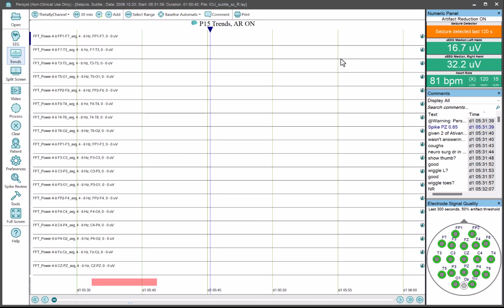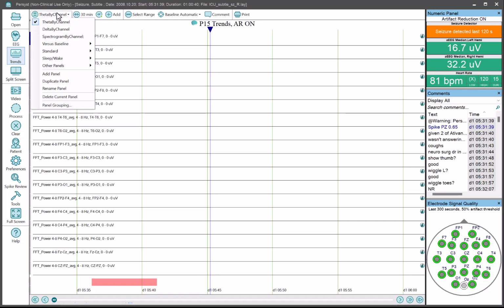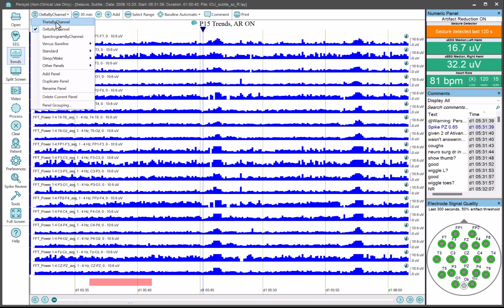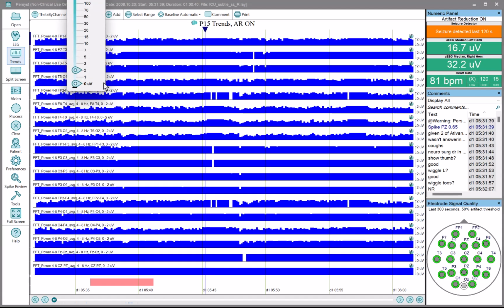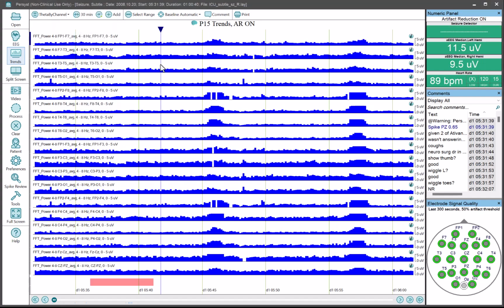All right, now let's look at doing this for something a little bit different, and you can see these trend panels are still blank. Why is that? Oh, easy enough. Scaling 0 to 0. That doesn't really work. I could have set that before, but since these are set under master control, I can just click the gain here and change that. Again, it wouldn't affect the CSV output, but it's nice to actually see the bumps.